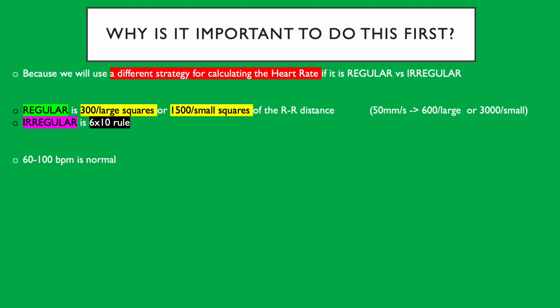Diagnosis to have 50 millimeters. Yeah, because it's more accurate. You see the differences. If you have a small Q wave, now it's double the size, so you can see it. But if it's too fast, you can miss it.